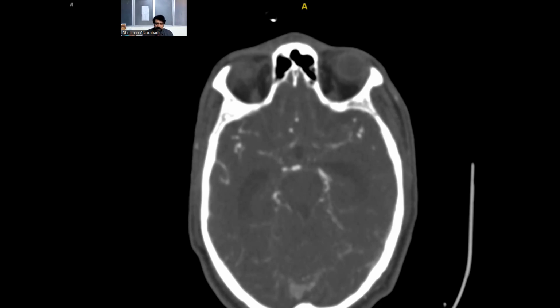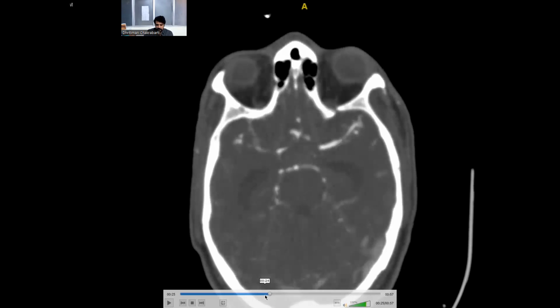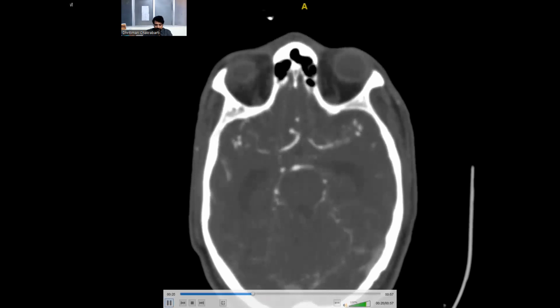Okay. So beyond this, there is not much to know about the ACA. You know the arterial territory that it supplies, the medial part of the cortex. Let's just look at what it looks like on the CT scan, and then we'll move over to the MCA. So let's just start a little posteriorly, a little inferiorly, where your ICA will start breaking up.